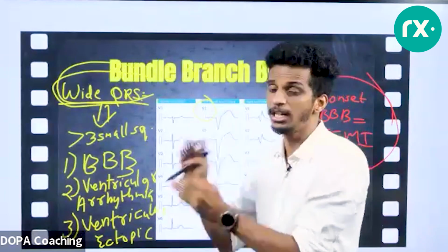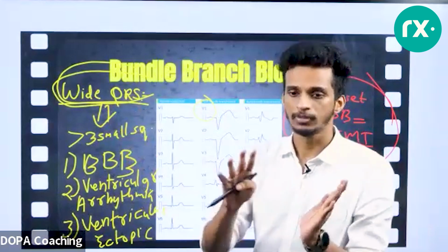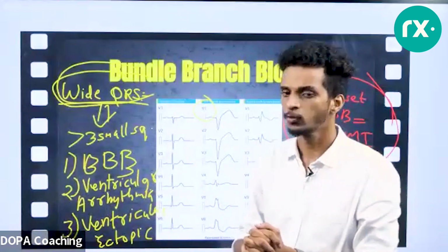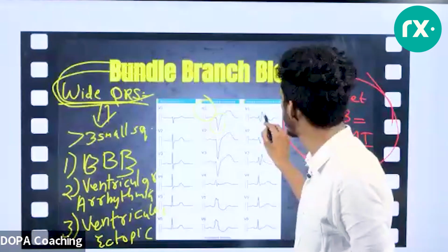So I am building your basics, guys. This is what we need. If you know all the things we have discussed in this session, the coming sessions will be pretty easy for you to understand. Okay. So I am seeing wide QRS here. I am seeing wide QRS here.